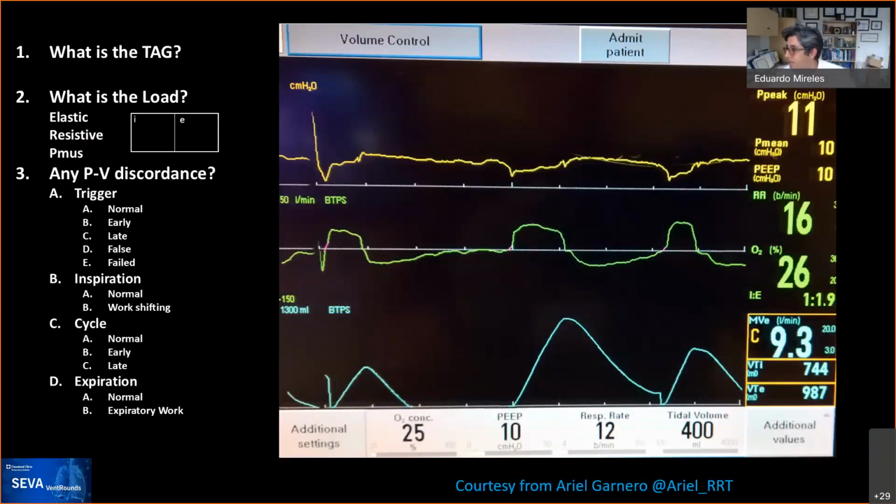Here comes the poll. Alrighty, go at it. So this is a common case that we see with this type of ventilator, and actually it happens on others, and you'll see today we have another beautiful example. Marcos, I'm not going to let you annotate because it creates something on the screen, so it's not lack of desire, it's just we cannot do that.